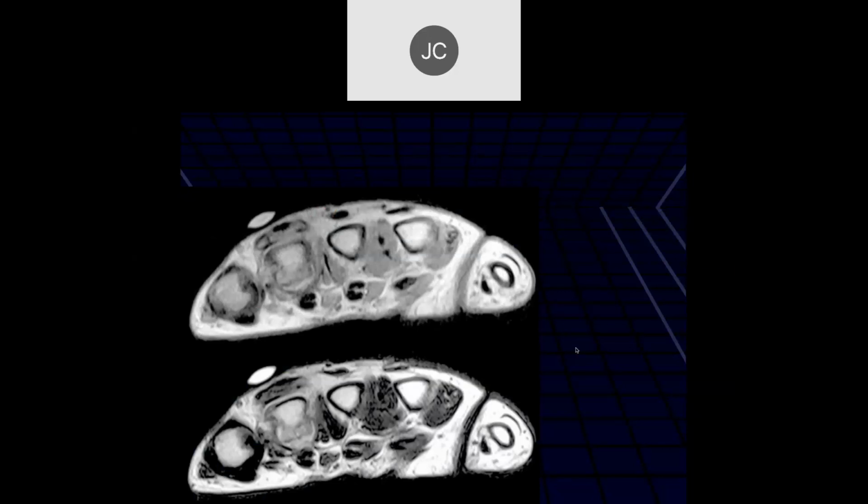Okay, Tayson. So I don't see the radial side of the extensor, the sagittal band as well. Yeah, so obviously the marker is where the pain is. So it's over the fourth metacarpophalangeal joint. Obviously, there's a lot of thickening and abnormal soft tissue here, but the extensor tendon looks like it's pretty close to the midline here, but then it's kind of a very diffuse abnormality.